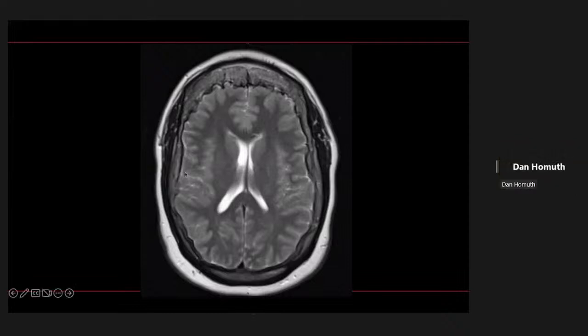No, I'm not sure. So there are certain seizure medications that tend to cause calvarial thickening over time. Oftentimes these seizure patients, I wanted to show you this in case you hadn't come across it before, just so that you don't need to go down all these rabbit trails of trying to figure out why the patient has a thickened calvarium. If they have epilepsy and they've been on medications for a long time, that's probably it and nothing to worry about.